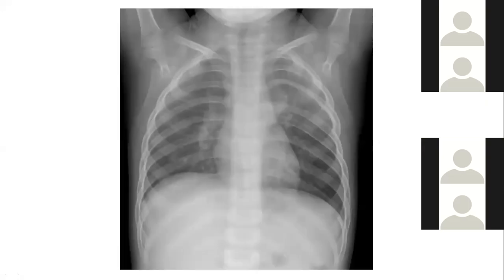Yeah, so this is a slightly tricky one. Can anyone try this X-ray? The first few X-rays are for you to identify, and in the next few slides I'll be just covering the theory part of whatever we have discussed till now, so that it becomes compartmentalized and we know how to differentiate. So the first 5-6 are for you to describe.